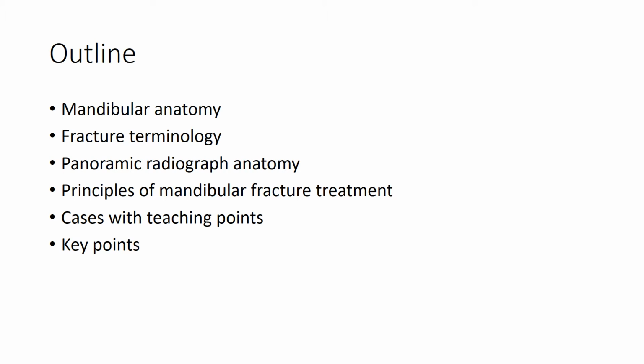In this lecture, I will review mandibular anatomy and fracture terminology. I will specifically discuss panoramic radiographic anatomy as this requires some familiarity. I will discuss the principles of mandibular fracture treatment and their implications for image interpretation. I will show multiple case examples and then I'll summarize the key points of the lecture.